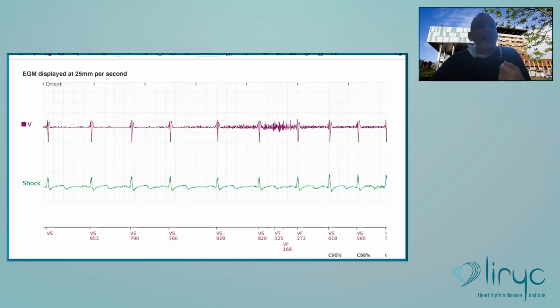So then there you may consider two solutions: either you modify the position of the lead, but you require a new implantation, or you may consider decreasing the sensitivity, increasing the value, just to avoid this, because it does not reflect the fact that there is a lead dysfunction. Okay, so I don't know if it's very clear, but two quite close situations, myopotential oversensing, but at the end, according to me, two very different situations, and you need really to consider one, change the lead, and the other one, try to see if you may find a solution.